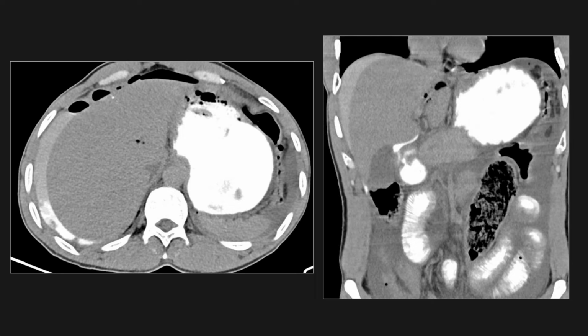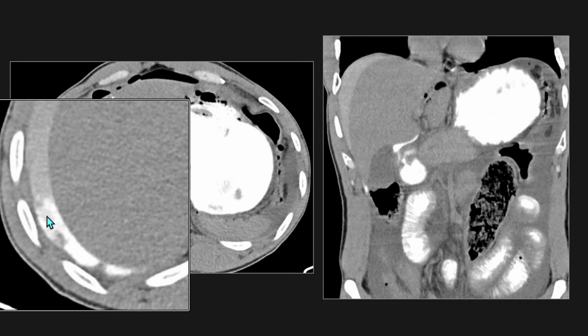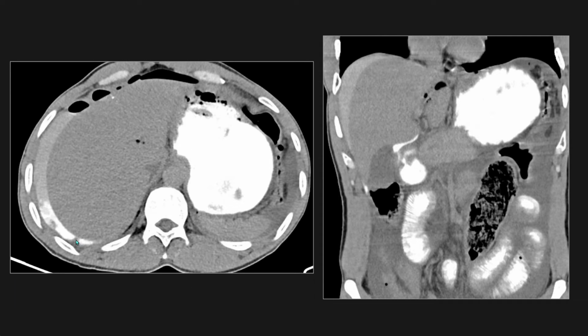This patient had free air, peritonitis, and could not receive IV contrast. He did drink some oral contrast before CT, admittedly more than was needed, and we can see some of that contrast that leaked out layering along the lateral and lower liver edge. The coronal images clearly show the thin channel of contrast leaking from the perforated pyloric ulcer, which helps to guide surgical repair and avoid a larger midline incision if the site of perforation remains unknown after CT.